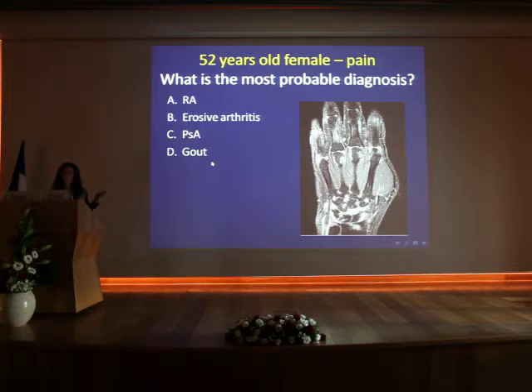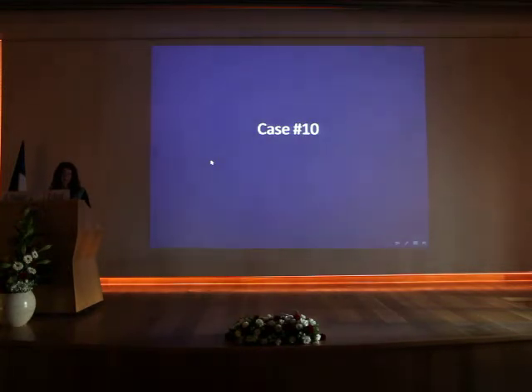So usually when you see something that doesn't make sense, something in the distal part and also in the proximal part, in the radial part and ulnar part, and you don't know how to make sense of it, think of gout, because usually it's more crazy. Okay.